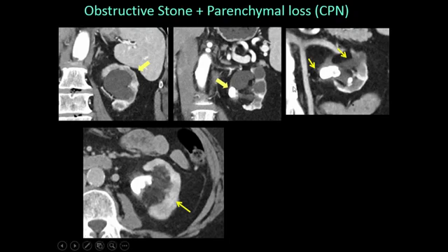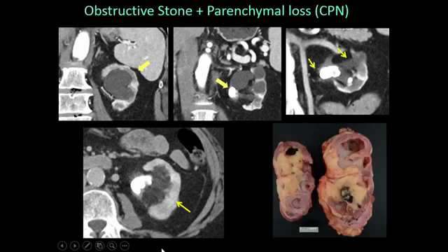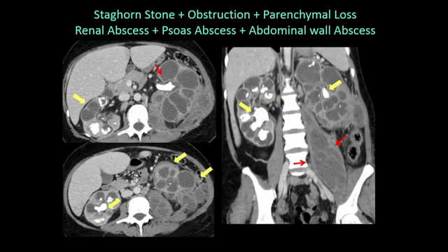Here is a patient with an obstructive stone, atrophy to the collecting system, a little bit of an infection around that stone. This kidney was not worth it to the urologist. It was already atrophic, has to go on to resect because this stone is infected. And so you have to remove it because that patient will come back later on with a big problem.